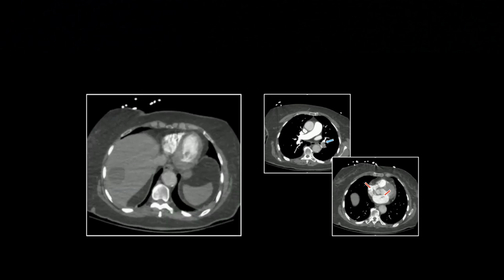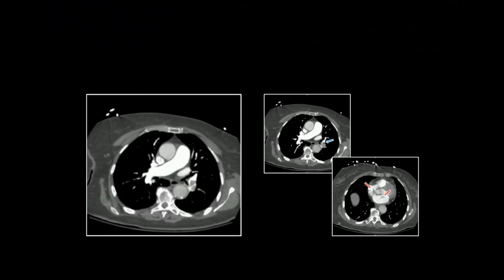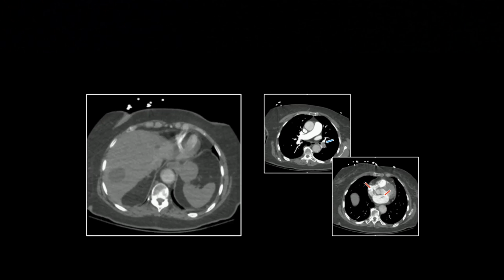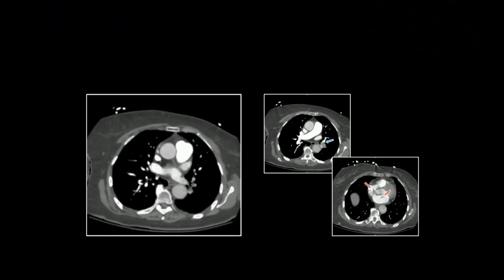All right, so there is a paradoxical embolism. Pretty cool. I don't think I would say that that patient's right heart is as large as the previous ones. And you know, a lot of these ASDs can be intermittent. A lot of times, when there's an appropriate pressure differential, they remain relatively closed.